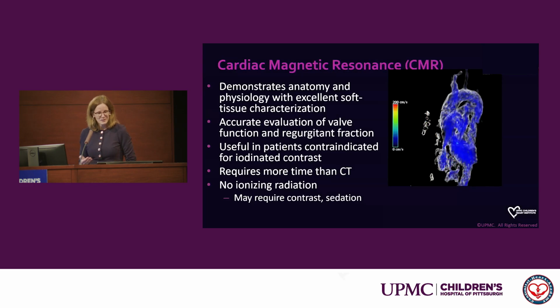So moving on to other modalities, we obviously have MR. We all love MR as a cross-sectional imaging modality because it can give you pretty much all the anatomic information that a CT can, but then also gives you information regarding LV size, mass, thickness, LV function, and then more information about flow dynamics in the left ventricular outflow tract, and I'll show you some advantages of this. There's obviously no ionizing radiation exposure. I often, with our scanner here, don't tend to use too much contrast in LVOT cases, but some may require contrast. And depending on the length of the exam and how much information is needed, may require sedation to get this done.